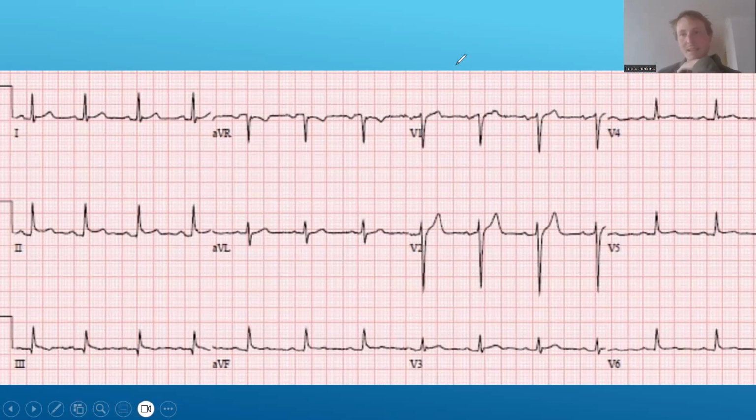I'm not going to painstakingly break down every single ECG going forward from here. I think I've given you 2 where I've explained my process a little bit. So from this point out, I'm just going to focus mainly on the abnormal and not really bring attention to the normal, if that makes sense. So again, looking at the forest of his ECG, there's a lot of things that stand out to me as being concerning. It doesn't look normal in a few different ways. So we're going to break it down with a pretty high degree of scrutiny.